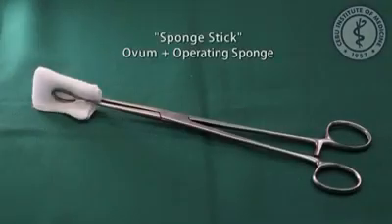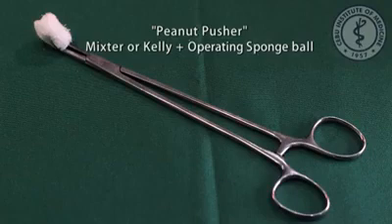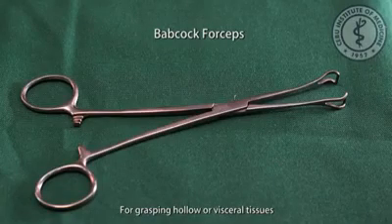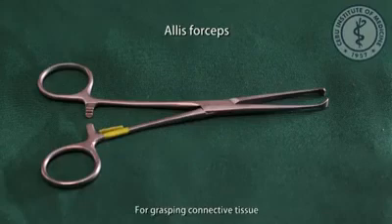Ovum forceps, sponge stick: ovum forceps plus operating sponge, for blunt evacuation of blood clots such as in exploration. Peanut pusher: Mixter or Kelly forceps plus operating sponge ball, for blunt dissection. Babcock forceps, for grasping hollow or visceral tissue. Allis forceps, for grasping connective tissue.